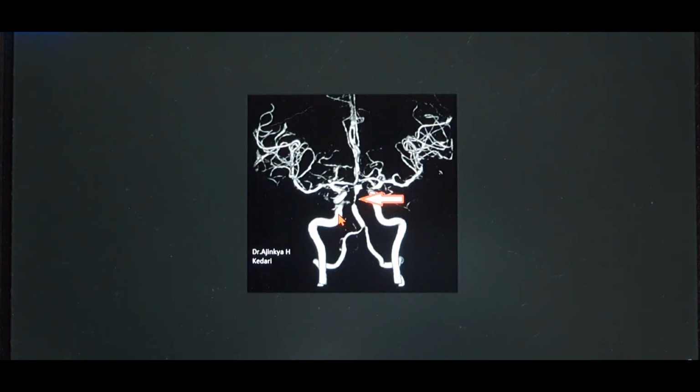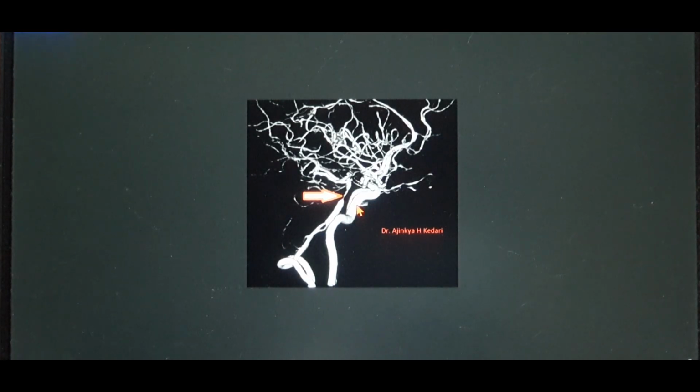Also, this is another variant of the angiography. You can see actually the same thing but at a different contrast level. You can see the arrow is pointing to the luminal narrowing of the basilar artery. Similarly on the lateral aspect, you can see this is a vertebral artery, the basilar artery. You can see there is a luminal narrowing of the basilar artery, and that's the internal carotid artery, the ACA and the MCA, and the pericallosal and the callosomarginal branches.